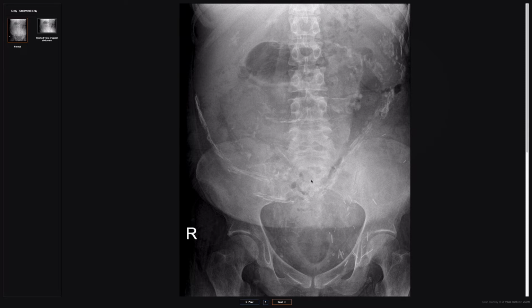Now in adults, there's a couple of different contexts in which you might see this. One is with certain types of malignancy, when they've undergone successful treatment, they can leave calcification. So I'm thinking about ovarian peritoneal metastases, they can calcify. And then the other thing is calcification as a result of long-term peritoneal dialysis. And this is known as encapsulating peritoneal sclerosis.